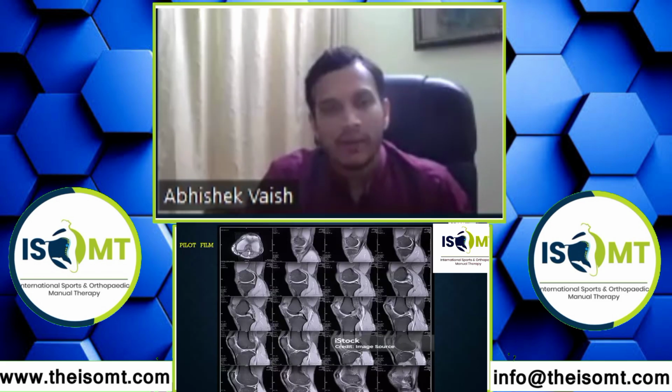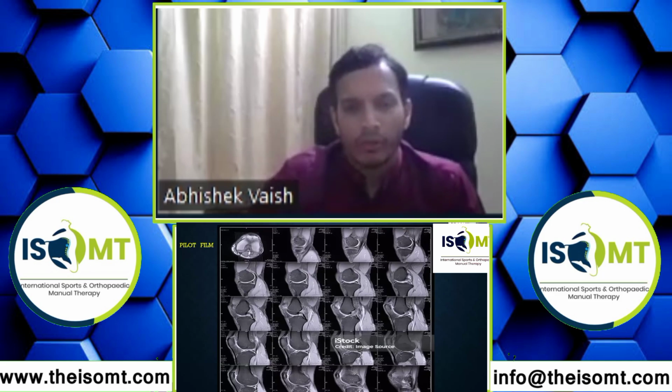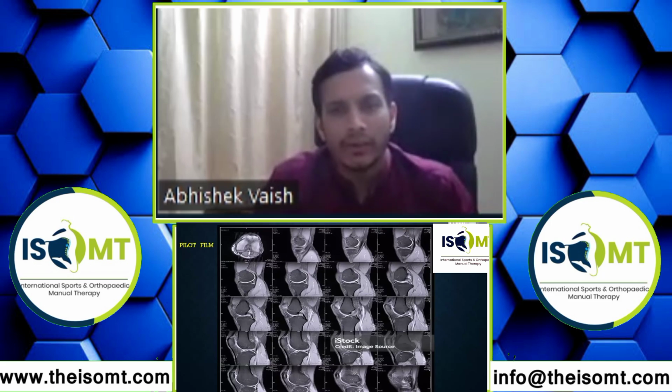In any MRI, this is the sort of MRI you will get in your clinic when you see a patient. So how to read an MRI? This study, suppose, will have around 20 images. So how do you know where is the injury? So this is a pilot film. When you get a pilot film, there will be cuts and there will be numbering like 1, 2, 3, 4. Every cut will correspond to which area it is showing.